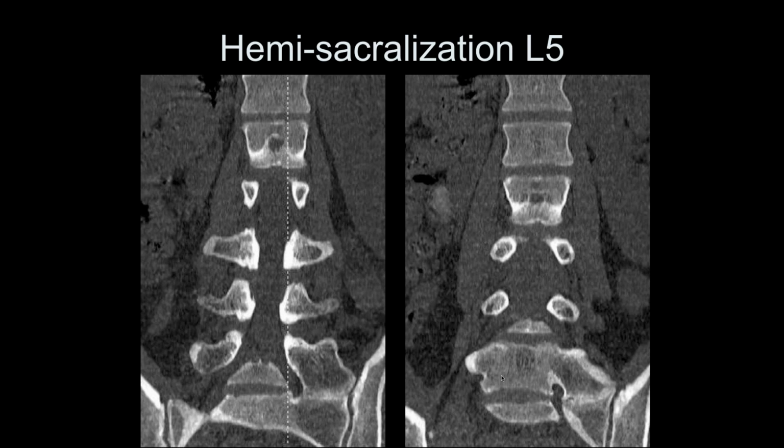So, what's this disease called? Or what's one name for this? People's names? I'm not sure. We talked about it last time. I wasn't here. I think I was in the last lecture. Yeah. Okay. Anybody else? What's the name of this syndrome? Bertolotti's. Yeah, Bertolotti's syndrome. So, you weren't here. So that's very important to remember, because, as I said last time, I think it's one of the most commonly missed significant diagnoses in imaging of the lumbar spine.